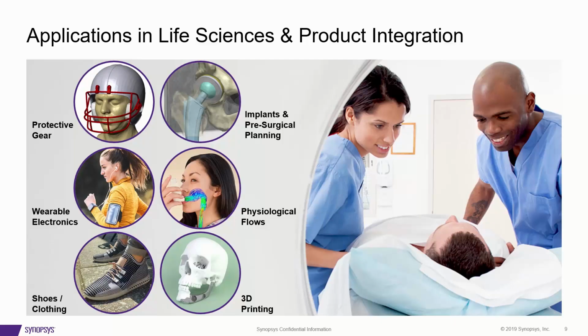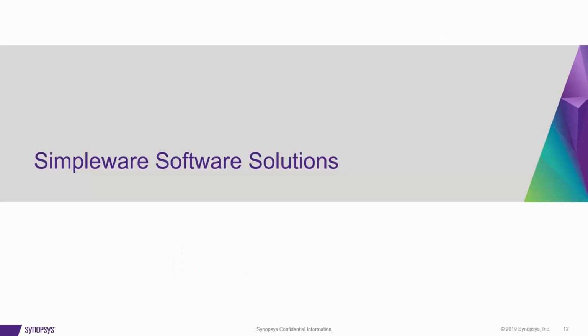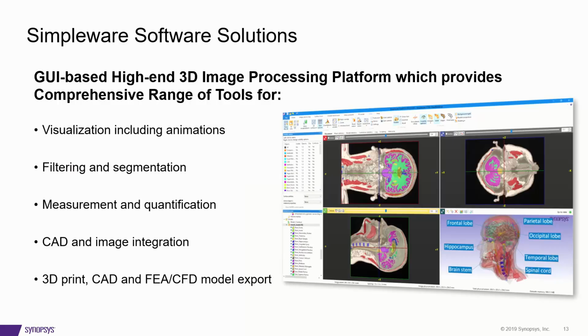But as I mentioned today, we're really focusing on the applications of 3D LifePrints, which is printing anatomical 3D models for surgical planning, aiding surgical planning, and the education of patients, and producing models for medical training. So just to briefly overview the different tools within our software, the Simpleware software is a GUI-based software.